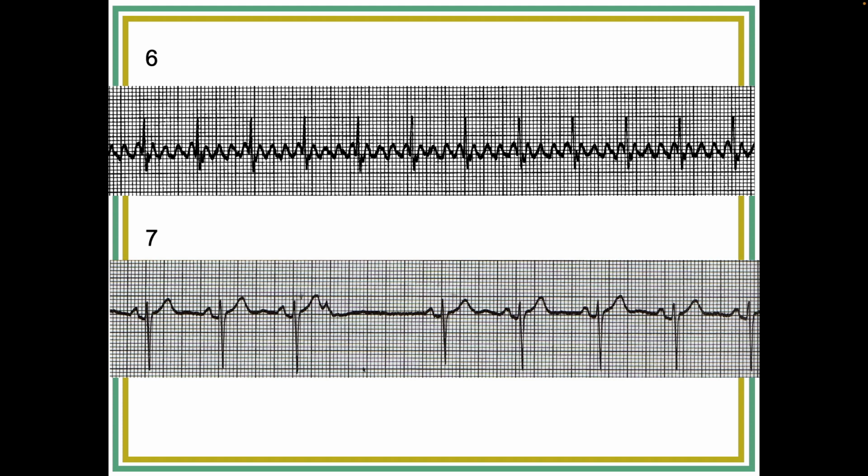this is causing the pause, okay? Because probably what happens is that the SA node is scheduled to fire off right about here. And probably it fires off, but because of the non-conducted PAC, the atria are refractory and not depolarizing. So that's what causes the pause. The non-conducted PAC, or a PAC, causes the pause. That's why there's a bit of a pause after all these premature beats. Okay.